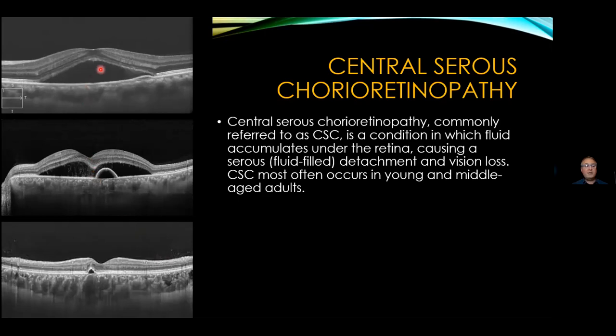And it can have different presentations on OCT. This is the classic presentation of a central serous. This is also classic, but they also have a small retinal pigment epithelial detachment there. And again, this is a patient that most likely has been treated, and the subretinal fluid is busy resolving, and there's a small amount left. Again, the longer that subretinal fluid is left, the worse the patient's vision is going to be long term.